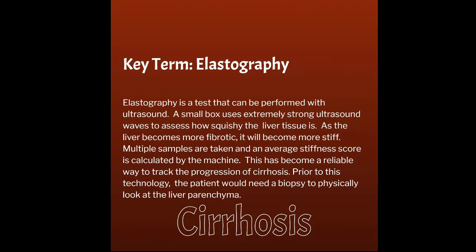The other way that elastography works is that we look back at the stiffness and density and speed of sound. We know that the density and the stiffness changes how fast sound travels through the body.